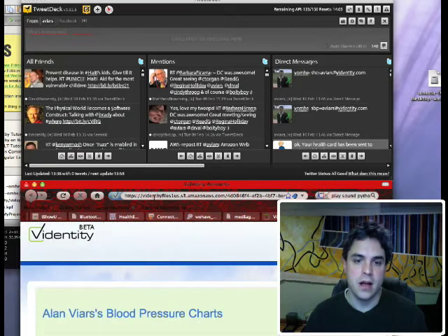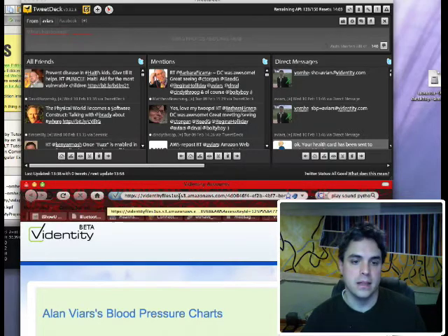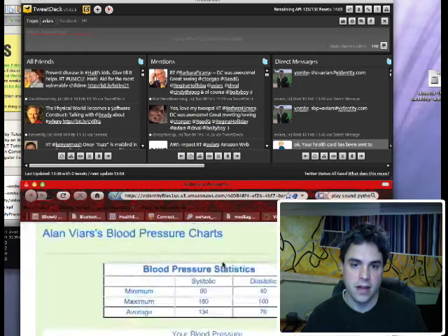And see this URL? This URL is a one-time URL, so it actually self-destructs. So when you send the information to someone, it's only available for a limited time. You see this is automatically generated on the fly.